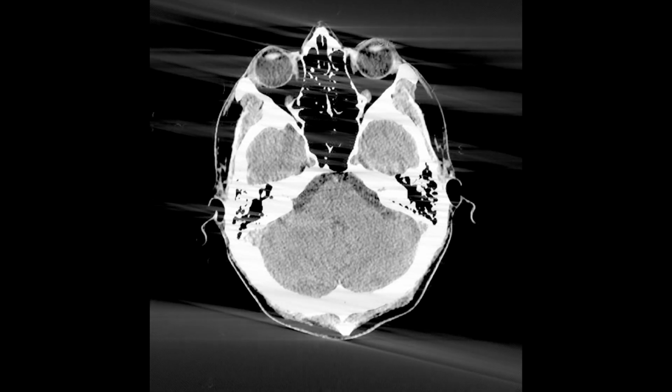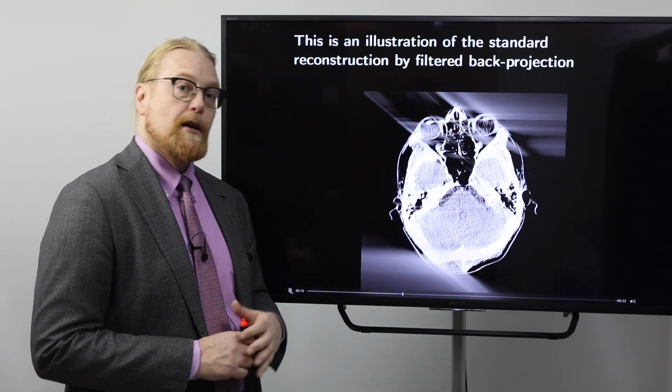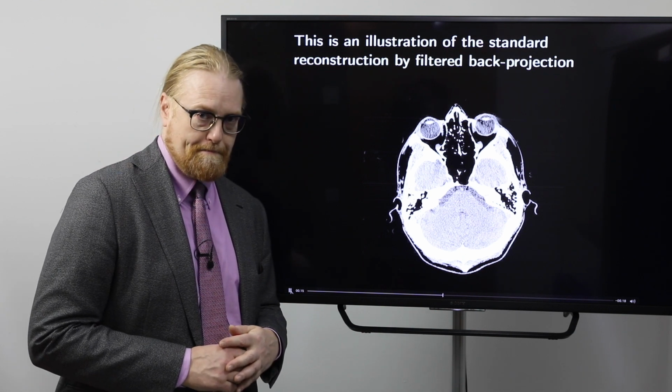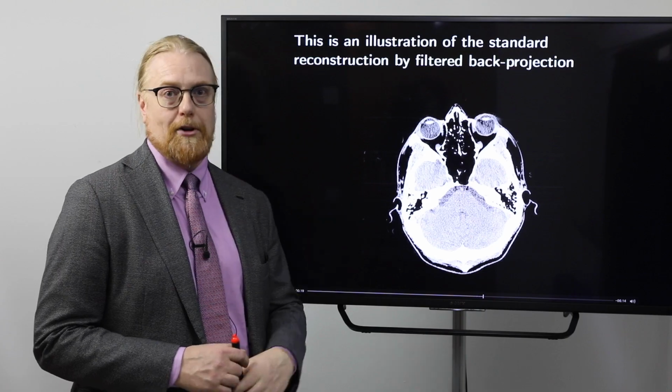This is the most usual reconstruction method for tomographic data. It's called filtered back projection, and you can see how it gradually builds back the image from the measurements. So after watching this video, you know what is happening here.